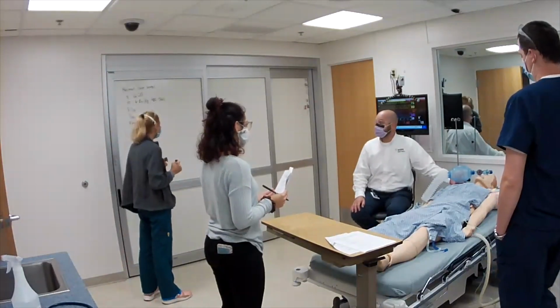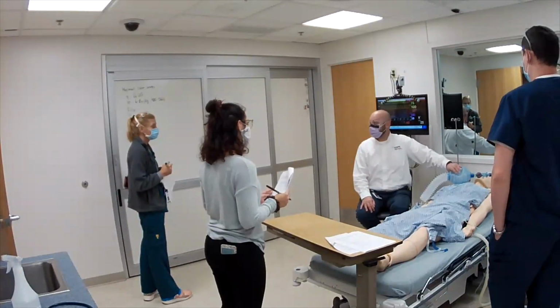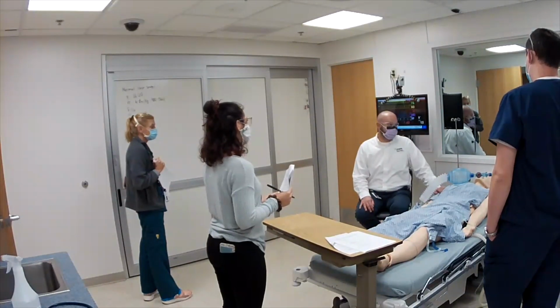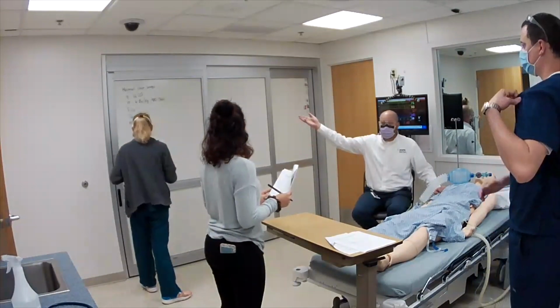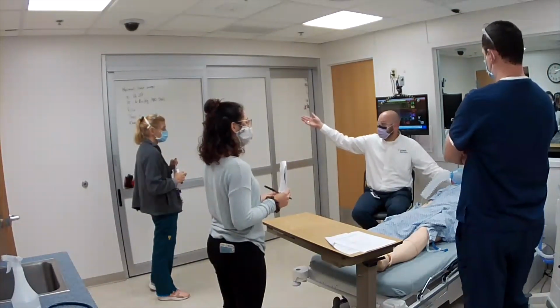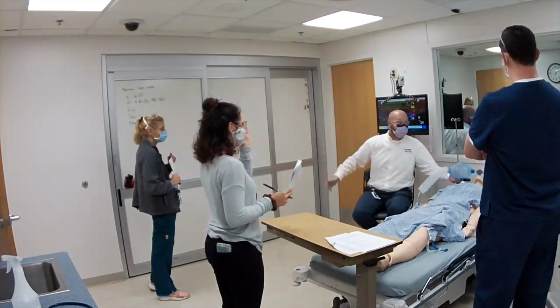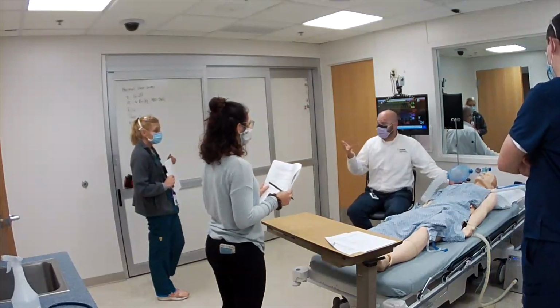If they air trap or if they start breathing over the vent, if we set that at 560, if he hiccups, he's getting 560. And if he goes on a hiccup and spasm, he's going to get 560 a lot, right? Exactly. So that's the one downside with volume control: it's not a super comfortable mode of ventilation.